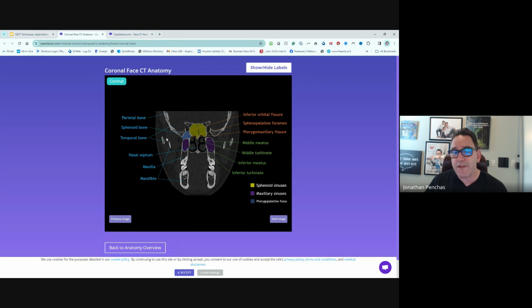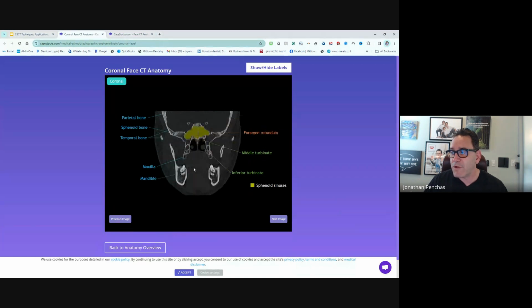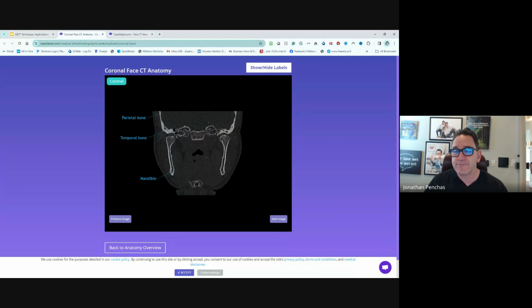And everything around, I will leave this for you to be able to see, but it's important. Again, if you took an x-ray that has the inferior orbital fissures and the pterygomaxillary and the meatus and everything around, and you're taking an x-ray that's that high, you need to be able to read this anatomy. If there is anything in the anatomy that's abnormal, you need to refer the patient to someone that will help you with it. That's why I don't take FOVs or CTs that are that high. I leave them very, very low because I don't want to read what I'm not familiar with.